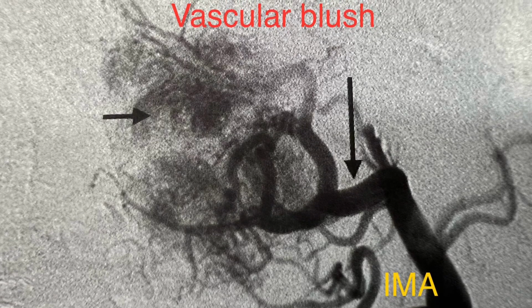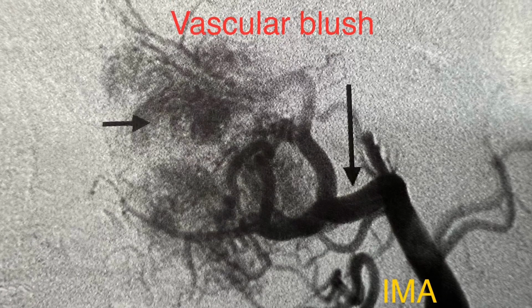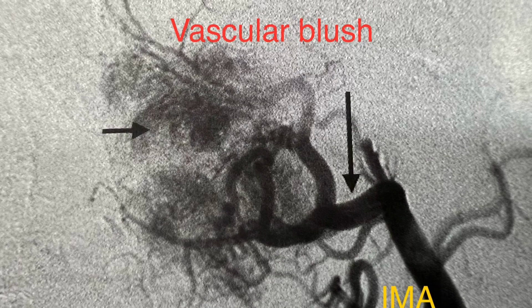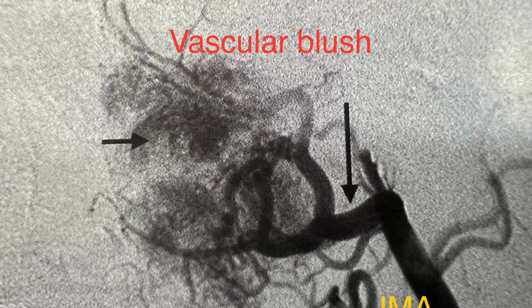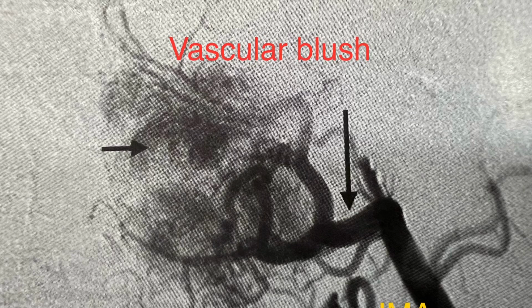Bone invasion manifests as avidly enhancing soft tissue mass on CT or post-contrast T1 weighted imaging of the MRI. Intracranial extension is more likely finger-like projection through the foramina rather than frank bone destruction, and treatment is surgical excision. You can do it endoscopically or externally depending on the size of the tumor.